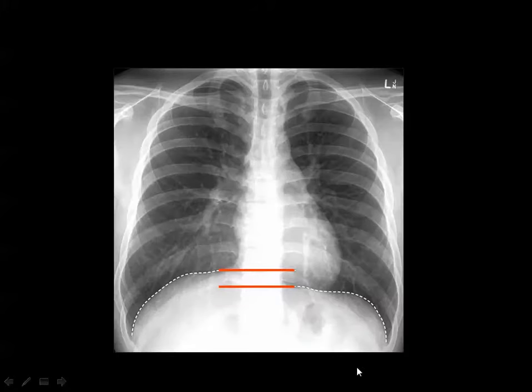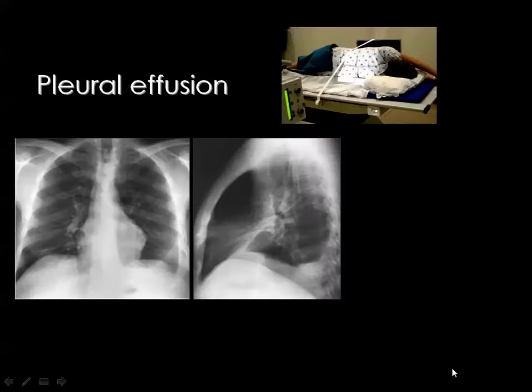While interpreting the chest X-ray, you should know that there is some difference between the level of the diaphragm on both sides, and this indicates that the right copula is relatively high compared to the left one by a distance ranging from 1 to 3 centimeters.